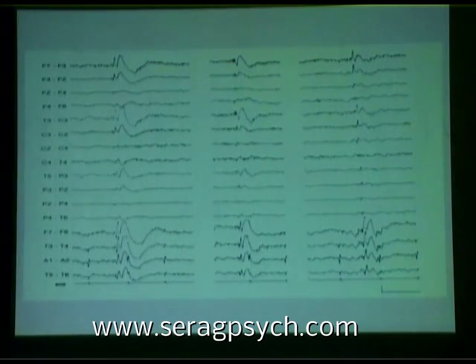Now, don't forget to use sometimes coronal montages going across. Remember when I was going through the principles of polarity, I showed that spike in the coronal montage. The coronal montage is very good because sometimes F7 and T3 can be equally involved, they can cancel each other, and sometimes you won't see the spike very well, and you'll need a coronal montage to show this clearly, you see. And you can see that F3 is a little bit negative next to FZ, but F7 is so much more negative than F3.